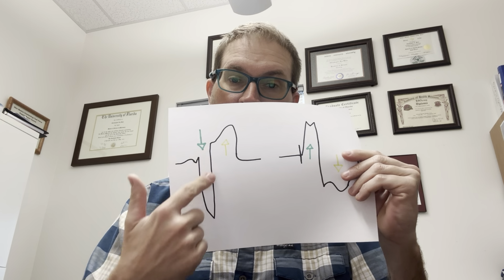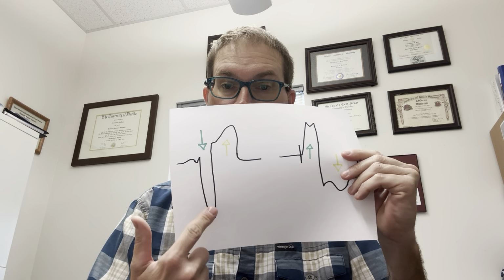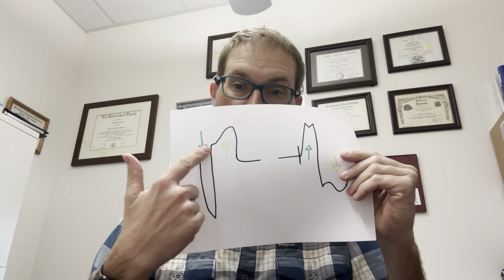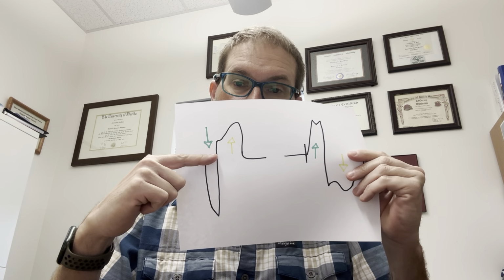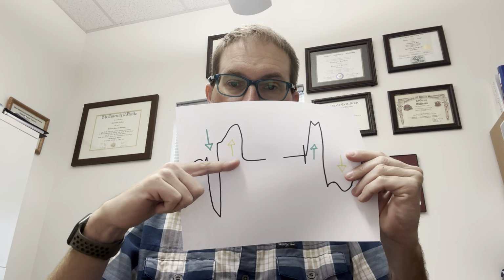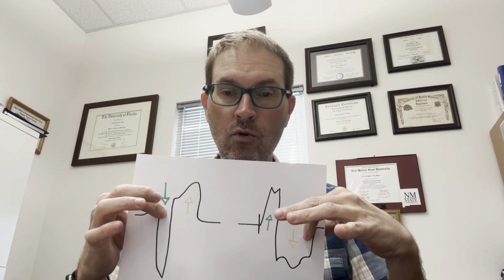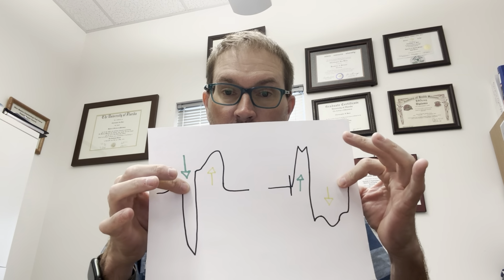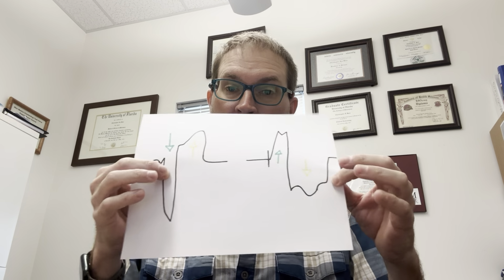So it is going in the opposite direction as the QRS complex. The QRS is going down, the T wave, the J point, the ST segment are going up. And you see that this produces elevation of that J point above the isoelectric line. So this produces ST elevation, which may be mistaken for ischemic or injurious findings, the current of injury.